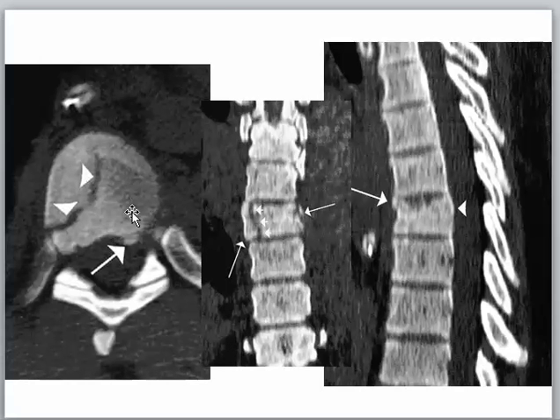There is fracture of this vertebra, and here we get a piece of bone inside the spinal canal, so this is encroachment which should be studied. Here we get the fracture line, and here another fracture line. There is some sclerotic deformity and compression, which is called lateral compression of the vertebra. This area is diminished in height than this area.